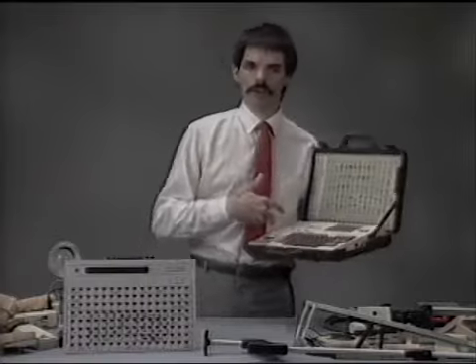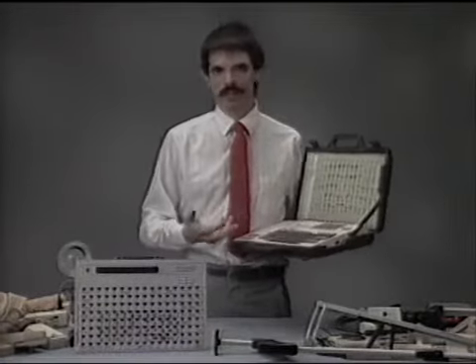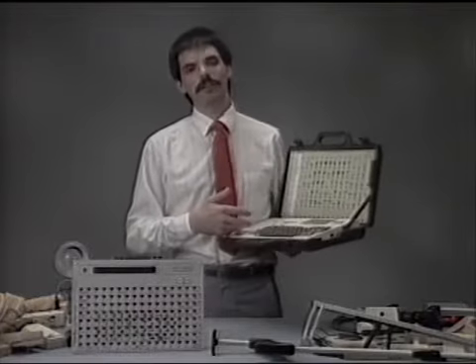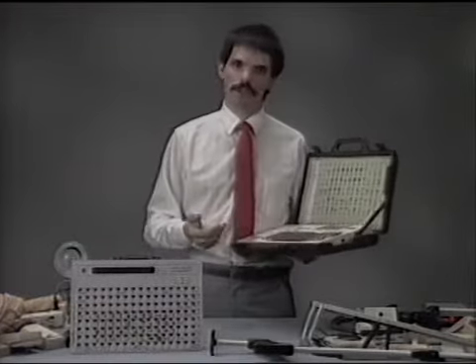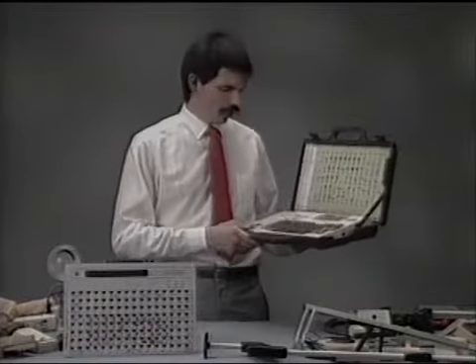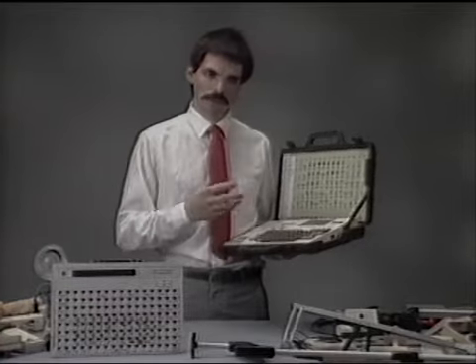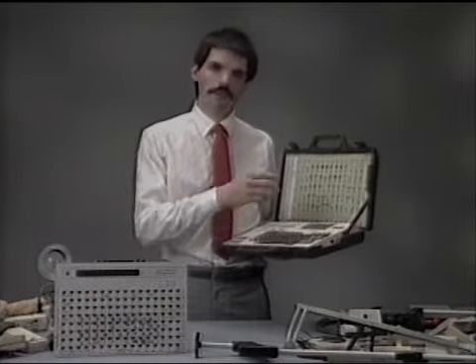But imagine if I gave my whole talk today using this device and typing each word. You saw how long it took me to type the word hello. If I was to say, type the sentence, may I have a drink of water with ice, please? Most of the television sets would be off by now. So we'll look at being able to take that phrase and compact it somehow so the rate of output is greater.